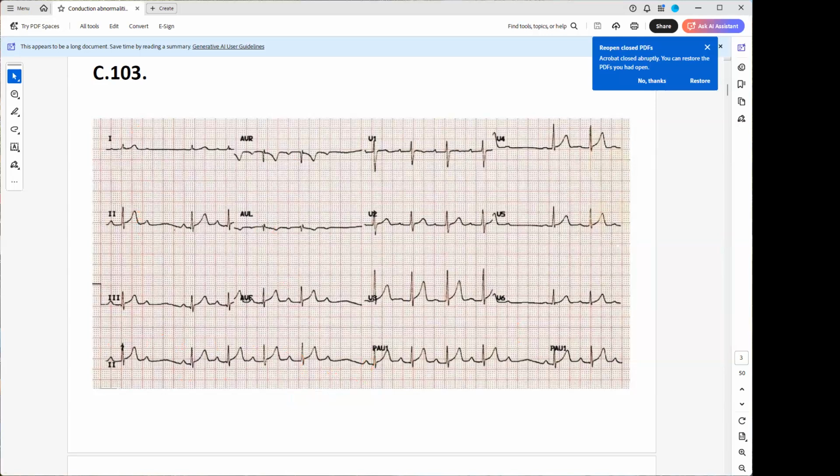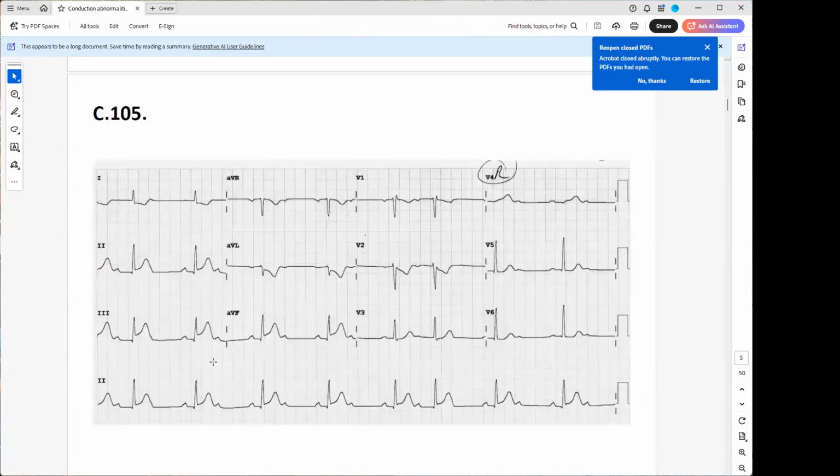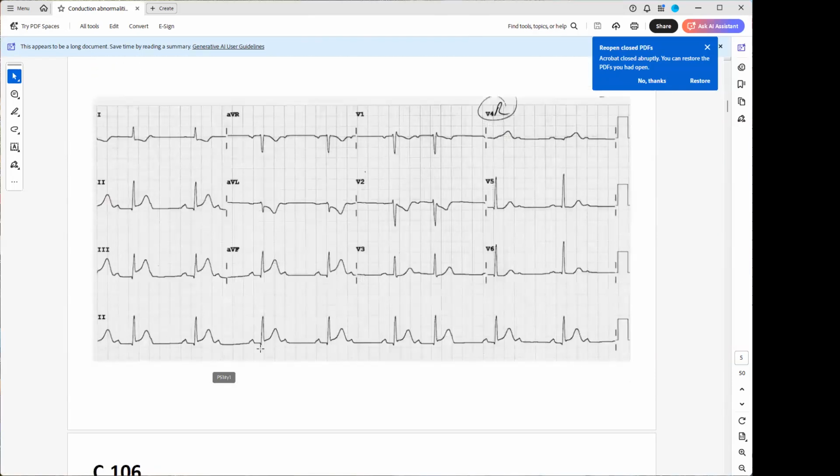Hello. I have number 105. Are you going to share it or should I share it? If you can share it, thank you. That's fine. So, first of all, I thought it's not rhythmic because we can see that every fourth we have a jump.